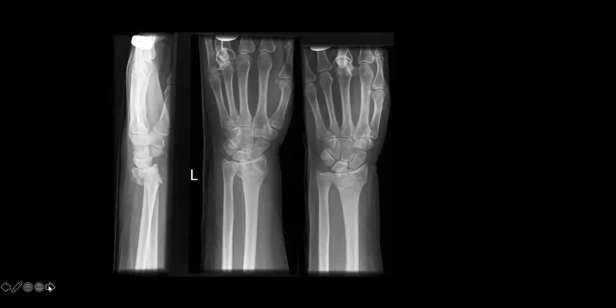Distal radius fractures are one of the most common injuries of the wrist. So if we follow our systematic approach from earlier and we look at the alignment, we can see that this is completely lost on the lateral view. If we look at the bone texture, we can see that there's significant disruption to the bony trabeculae of the distal radius. And lastly, on assessment of the cortex, we can see that the cortex is not intact at all. With regards to soft tissue, it's quite difficult to assess here, but obviously the more extensive your injury is, the more extensive you expect the soft tissue swelling to be.